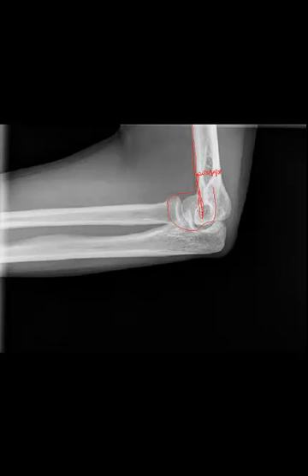a supracondylar fracture. Now, of course, you will have multiple views to evaluate this on, and so this should not be the only view to see that finding if it were present. However, multiple views and alignment relationships are useful when you're trying to evaluate for abnormalities.